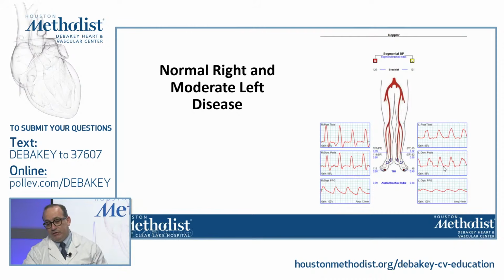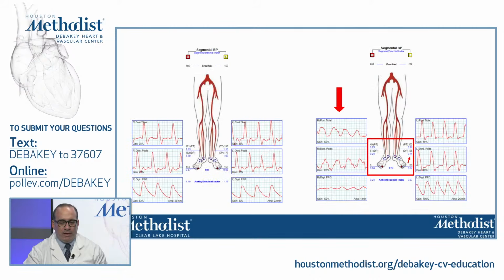The dorsalis pedis or anterior tibial vessel here, it could potentially be almost a biphasic as opposed to a monophasic waveform like it looks up top. But there's a slight morphological change or a significant morphological change compared to the right side. So we know that there's disease on the left side. That's also confirmed by the toe brachial index at the lower end of the mild range.